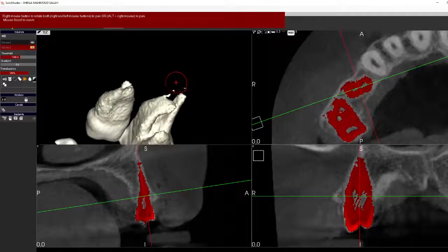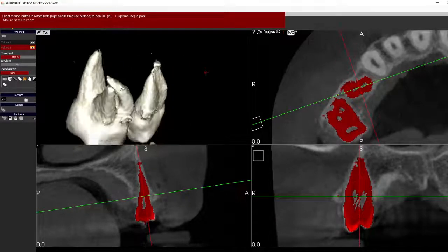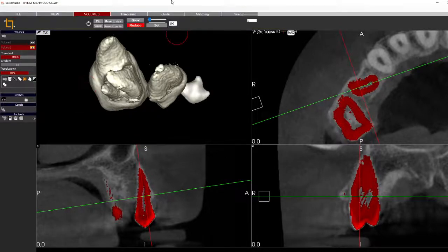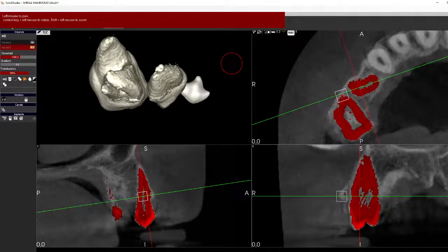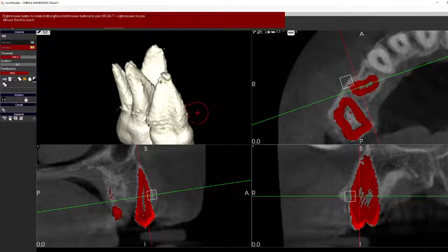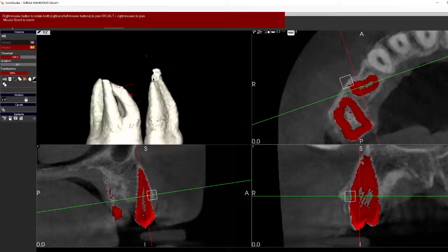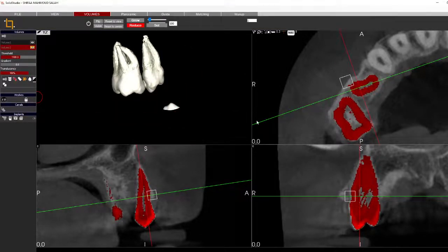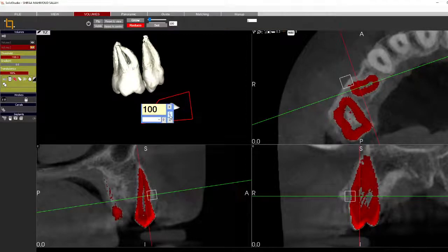Now we need to delete these. Now it's okay, it's almost done. We just need to make sure that these sections here, you go to the level of the structures here. Again, on reduce, using the right mouse button now. Okay, these are okay. Now we need to delete this. It's almost okay, and you can go here, some touches here, but it's okay. If you want to delete this, you use the edit tool, click, double click, and finally delete.